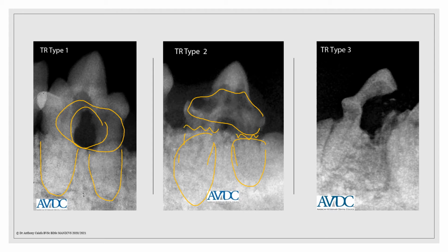And so these are the typical missing teeth, where there's a bulge in the gum tissue over the resorbing or replacement resorbing tooth root. So these roots will end up becoming bone. In a type 3 tooth resorption, we have a combination of type 1 and type 2. So if you look at the radiograph on the right hand side, we have a normal periodontal ligament space around that root, but we're starting to lose it around the distal root of this tooth, this premolar tooth.